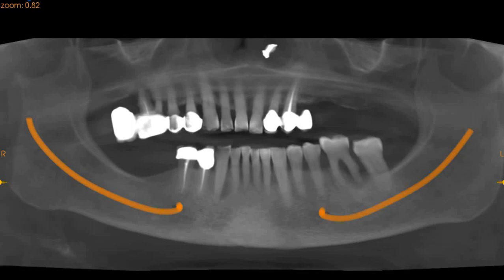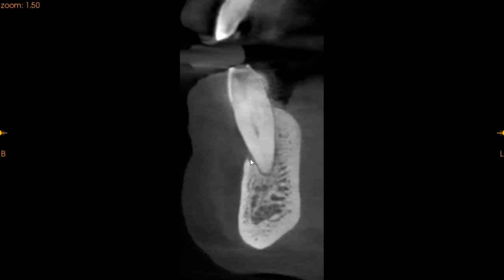Now, on a transaxial view, which is basically the proximal aspect of the teeth, we will show you one by one. The lower right canine looks something like this. So we've got a lower right canine which has minimal bone support on the buccal aspect. We'll zoom in for our kind doctor. There is minimal bone support, and we see PDL widening and a periodontally compromised tooth.